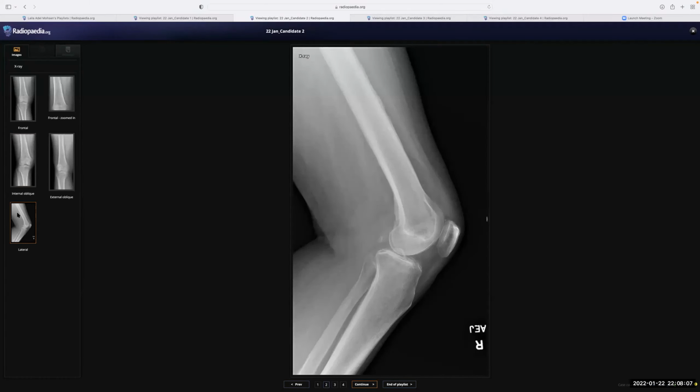So in this patient with effusion, I would be concerned about an infectious process like osteomyelitis. And the next likely differential would be a malignant lesion, although there is no extraosseous soft tissue component, so less likely. The next step here would be an MRI, contrast enhanced MRI for further evaluation.